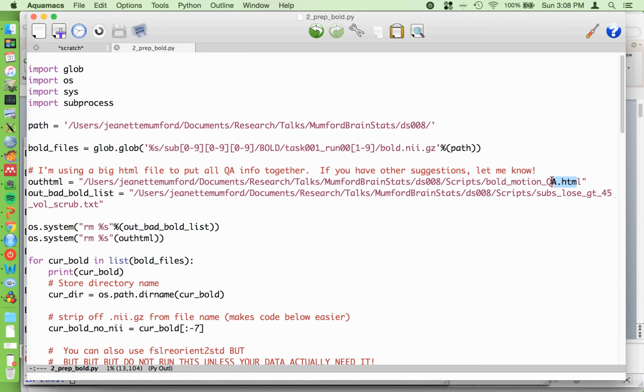So I typically try to print it to PDF and then I move the PDF to my computer because otherwise the images won't load. But even that, for the system I'm currently using, for some reason it can't handle either. So if somebody has a better way to do this, a way to put PNG files and text together that's not an HTML, let me know. I'm not going to get picky. I don't think I could directly make a PDF, but maybe. But this will work. It's worked everywhere else I've worked. It just doesn't work on the computing system I'm using here at Wisconsin.